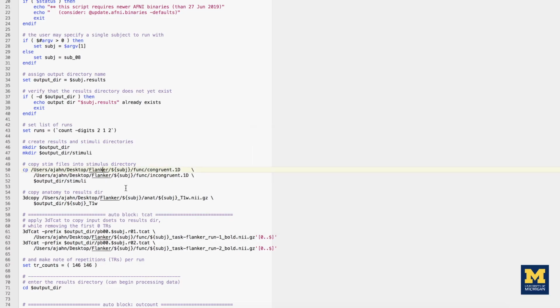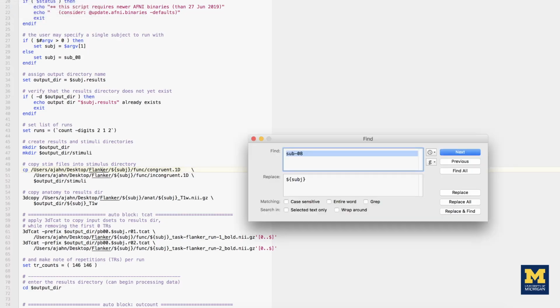We will replace this with the $pwd variable, which is a shorthand for the path to the current working directory. This will ensure that the script will be adapted to the current computer's directory structure, and that no errors will be thrown due to the script being unable to locate where certain files are.